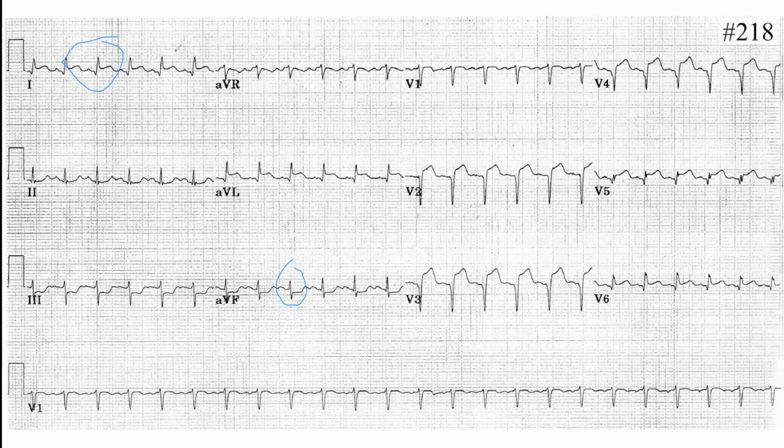Lead 1 is positive, so you are on the left side.